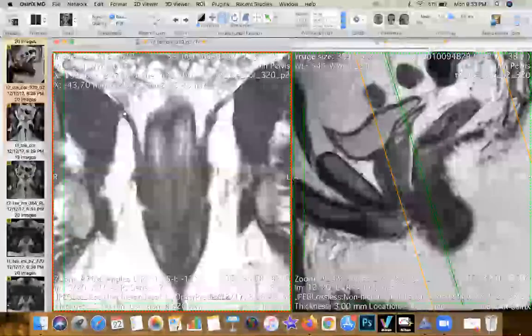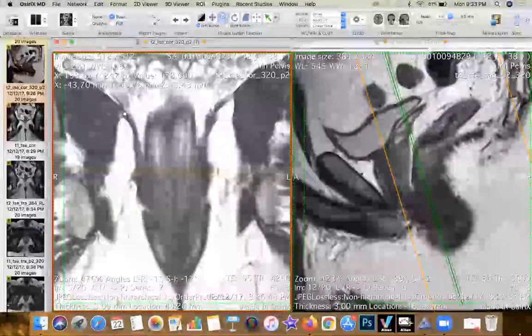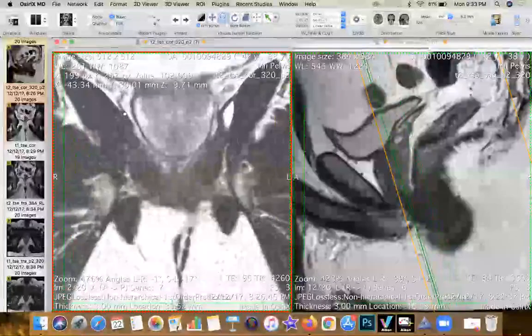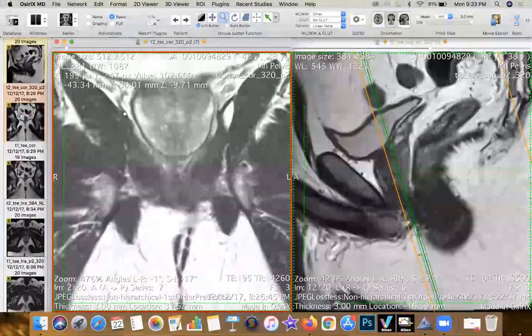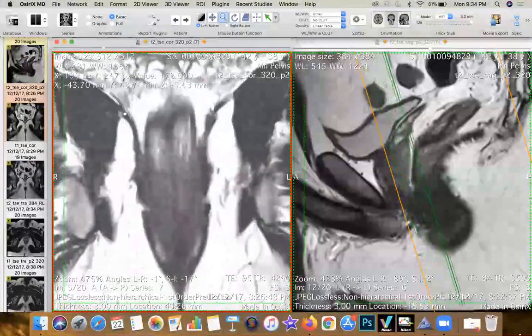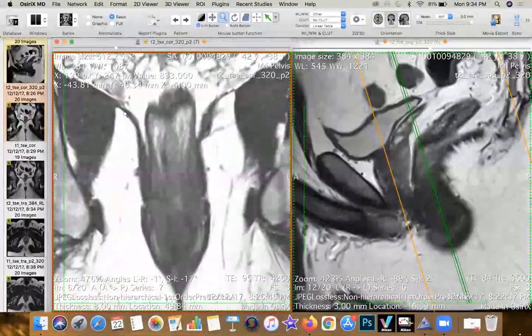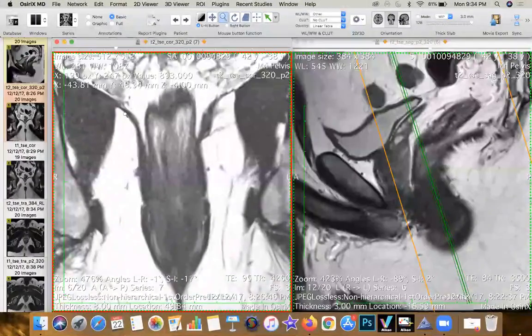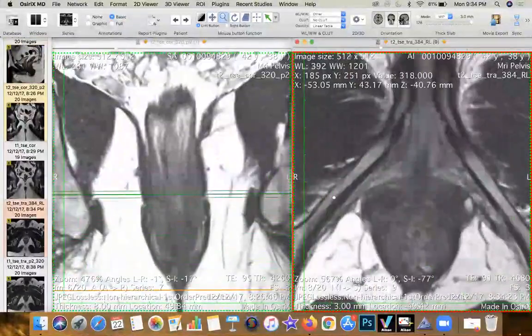But when you get an asymmetric muscle process, you tend to see diffuse thinning, or sometimes patchy areas of thinning, or even discontinuity of the muscle. That is of significant importance. Therefore, it's very important for you to identify each component of the levator ani, because you need to predict which component of the muscle is the problematic component when you're looking at pelvic floor diseases. By and large, the levator ani is divided into two major structures, which is reinforced posteriorly by the third muscle group. We'll start from anterior to posterior, and what you would have is the two major groups.